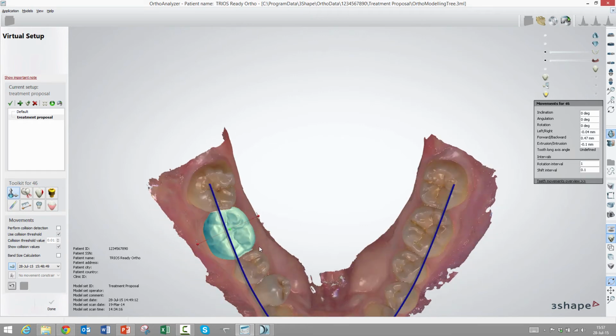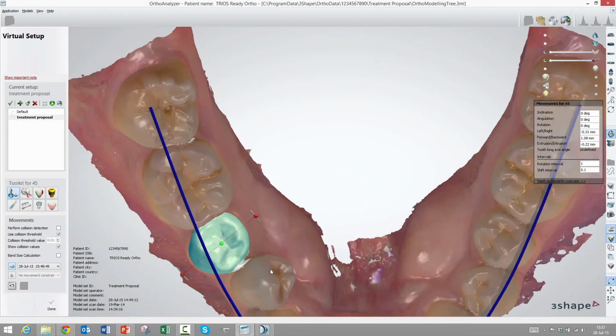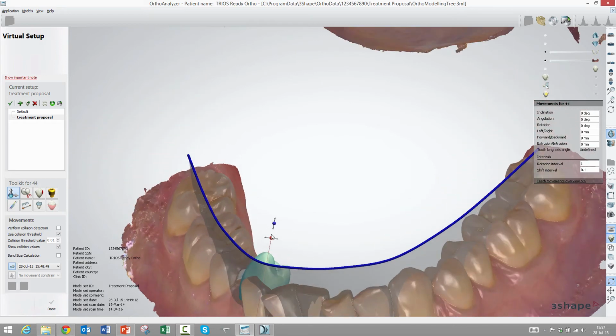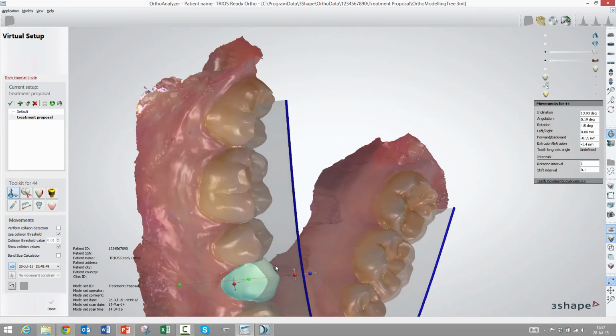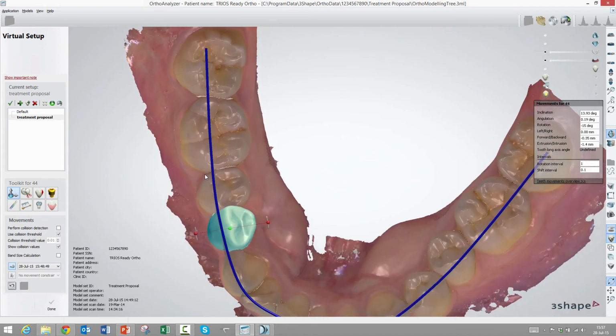It's quite neat here because you will be able to have a better idea of where you can or cannot move according to some fixed reference. Oh, nice. So now I'm going to also extrude this one. You can see I have all these different measures or controls of my movements. And here on purpose, I'm going to do some overlap or intersections between the teeth, because we have a way to detect them.